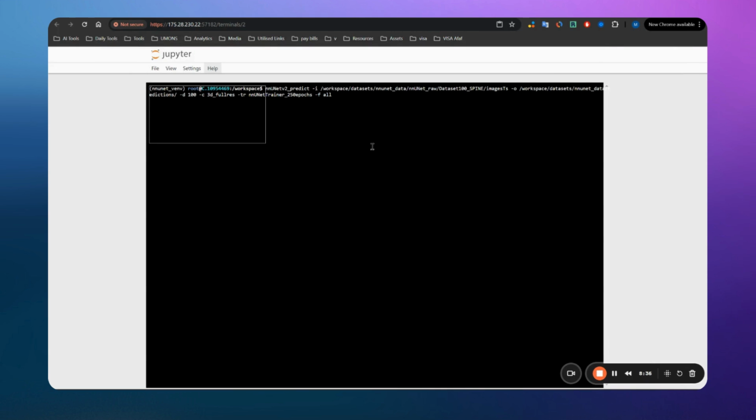And then after the path to the predictions, we need to specify the ID of the dataset, which is 100. I will let you know why we are doing this: nnUNet built their model to search for your inputs, outputs, and arguments automatically, but I don't like that way. So we have 100, which is the dataset ID, and we need to specify which configuration we use, which is 3d_fullres, then which trainer, and here I think I missed something. For the fold, it is not all, but it is 0.